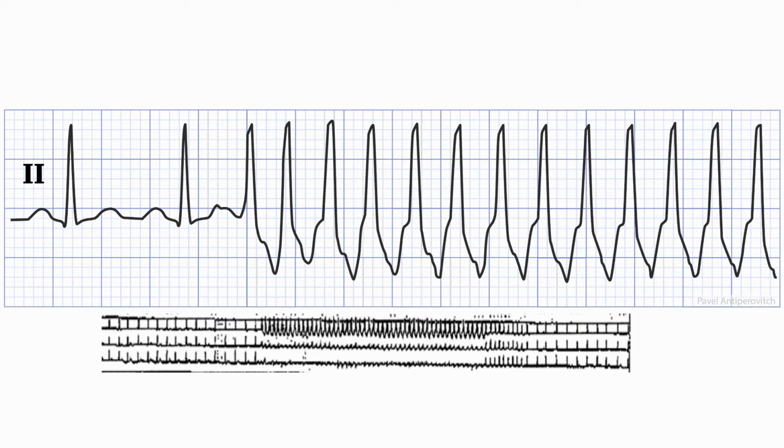this arrhythmia. And looking at the tracing, we have 2 beats of sinus rhythm at the beginning, and then we have the initiation of sustained, regular, wide complex tachycardia. So the main problem here is a wide complex tachycardia.